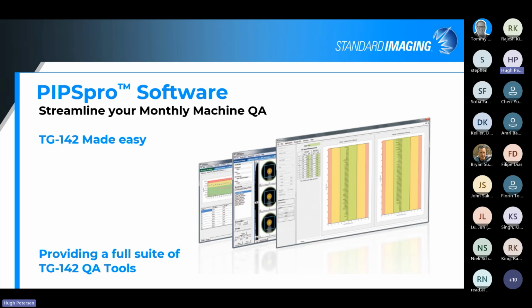I'm sorry, the CATphan that's actually typically provided by Varian or Elekta accordingly with their cone beam CT system. I'm kind of stuck on the CT sim check today. Elekta includes the CATphan 503, Varian includes the CATphan 504, both from Phantom Laboratories, but we have that functionality as well.